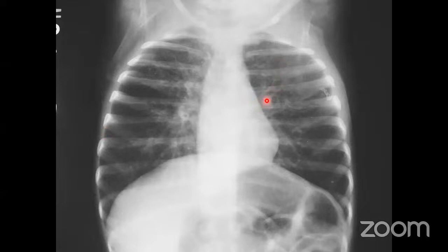So interstitial pneumonia: you can see the septal thickening and the linear markings even up to the periphery. If you just draw lateral, this is the middle, and this is the medial. In case of hyperreactive airway disorder, you can see changes at the medial lung fields. But if you follow to the lateral, even at the periphery, this is a case of interstitial pneumonia.